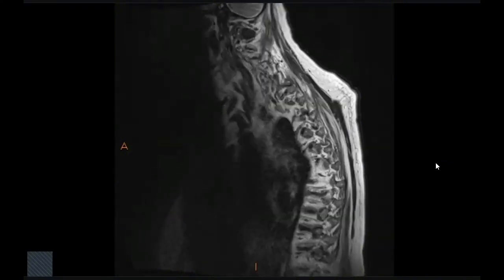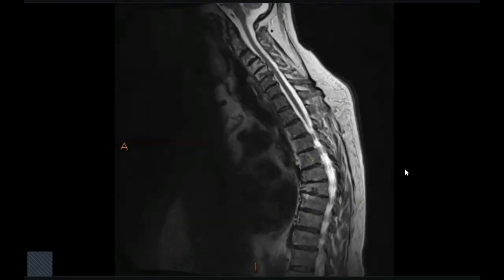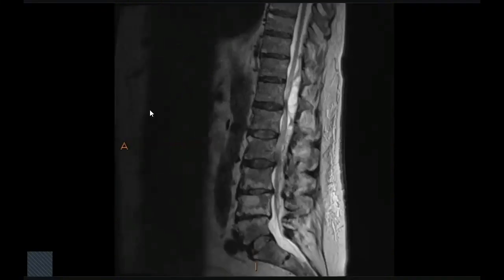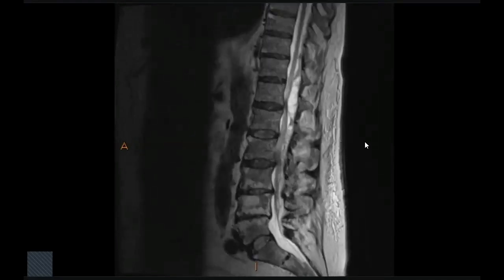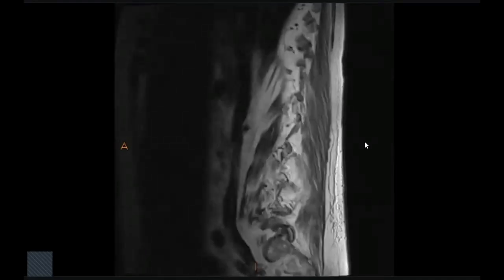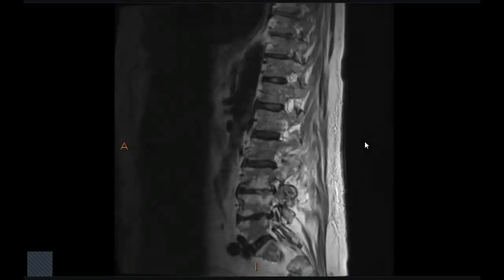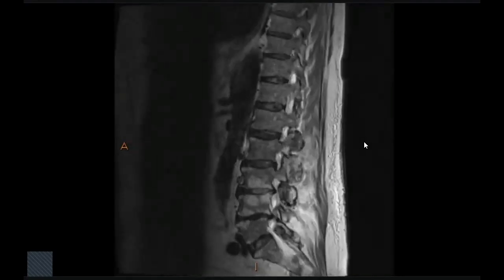Okay, no problem. As the patient underwent lumbar puncture before and there is decreased movement of the lower limb, we did a lumbar MRI. You can scroll. Right, so this is the lumbar spine MRI, T2 weighted sagittal images. Again, there is inhomogeneous bone marrow signal with increased hyperintensity on T2 weighted images in the lower lumbar and the sacral vertebrae.